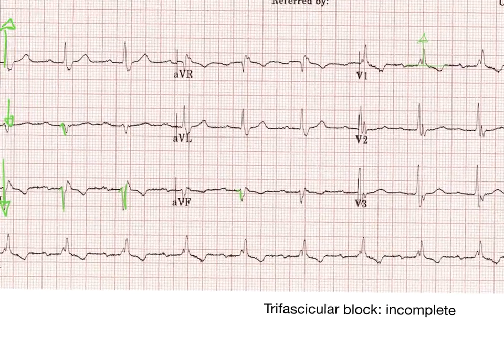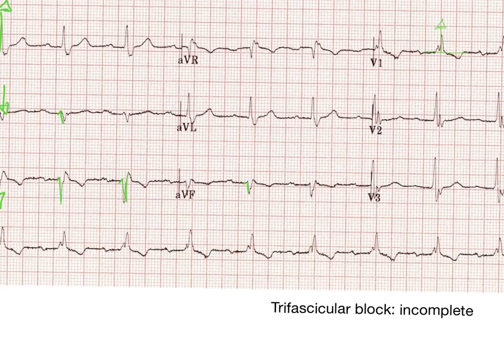Let's go down here to our rhythm strip. What do you notice? Junctional. There's a P wave. Isn't the P the down after that? Yeah, it's right here. It's a biphasic P wave, but it's a P wave there. It starts here and then ends there. It's what we call a biphasic P wave. But what can you guess about the P to R interval? First degree AV block. Would you guys all agree? What does that give us?